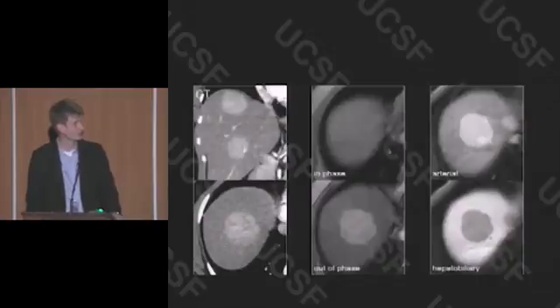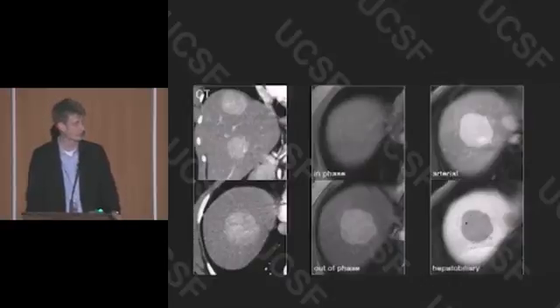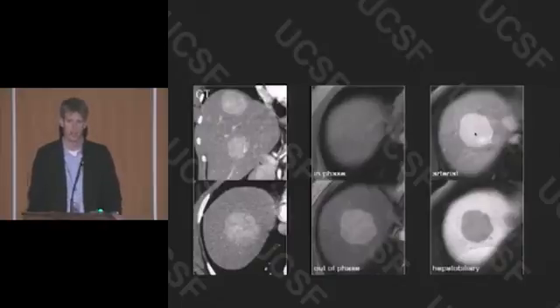So here's a classic adenoma, arterially hyperenhancing on CT. On opposed-phase, this is a little bit tricky. This is a patient who has a very steatotic liver, so it's actually focal fatty sparing compared to the normal liver. So when you look at the in-phase, opposed-phase, you're losing signal from the adjacent parenchyma. This lesion is actually fatty sparing. On the hepatobiliary phase, though, it's hypointense, right? Not like an FNH, hypointense, and obviously it's arterially hyperenhancing on the MR arterial phase, okay? Adenoma. It can also have the focal fat or fatty sparing associated with it, something to keep in mind.